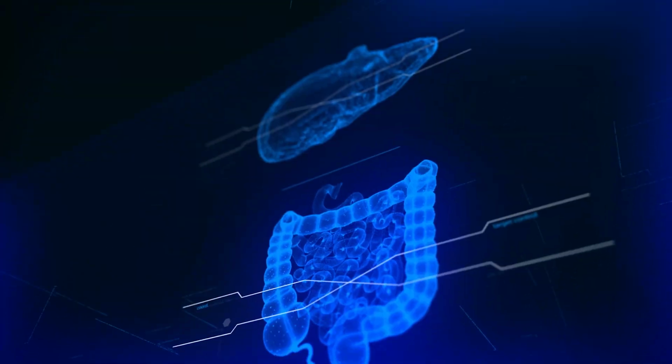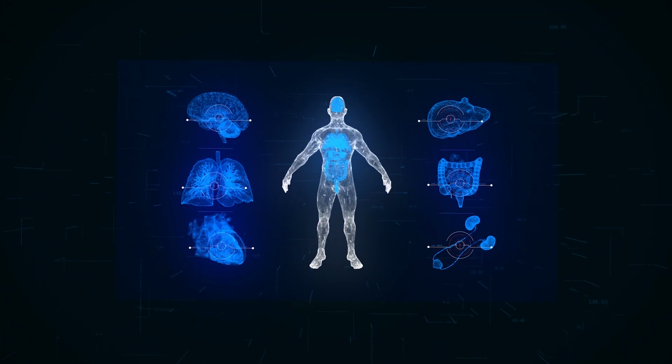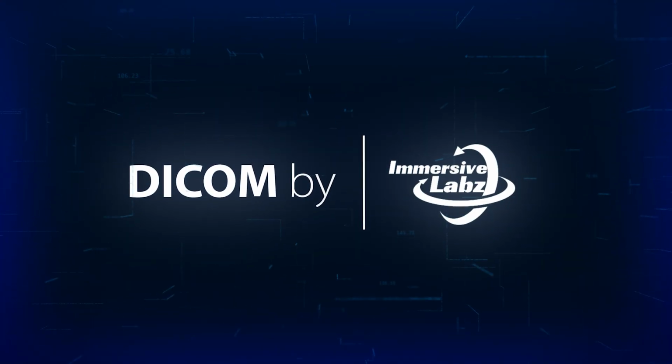Welcome to the Cadaviz DICOM viewer tutorial. In this video, we will explore its key features and tools for medical image visualization and analysis.